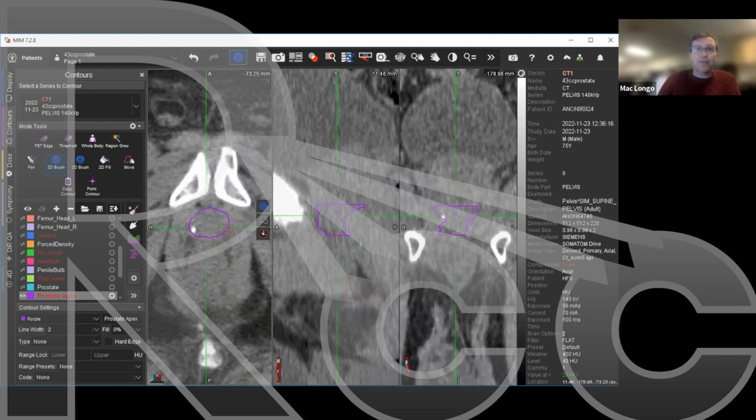And why is that a problem? Well, that's urethra, so you're now increasing the risk for urethral stricture down the road, because we're exposing it to a high dose of radiation therapy, and there's no cancerous tissue there we're trying to treat.